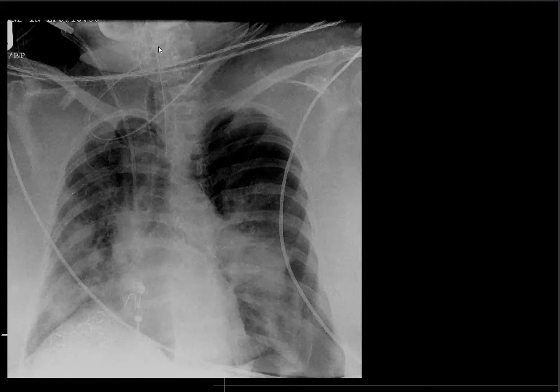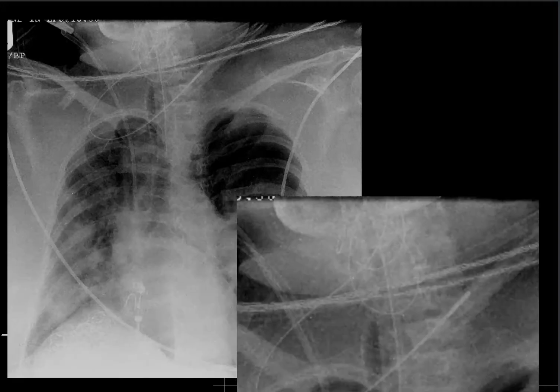So if you start feeding the patient, all you're going to do is get the back of your throat filled with feed. It will be aspirated and the patient will have a pneumonia, which I think he already has actually. Let's look at that more closely. There we are, magnified. The nasogastric tube curled in the oropharynx. So important to check where our tubes are.